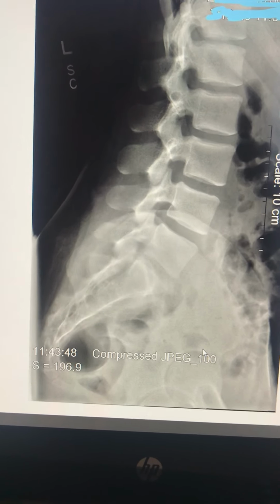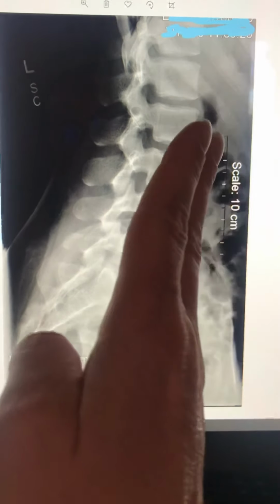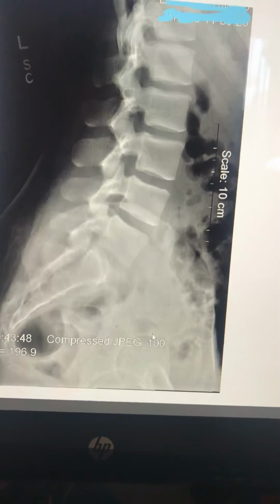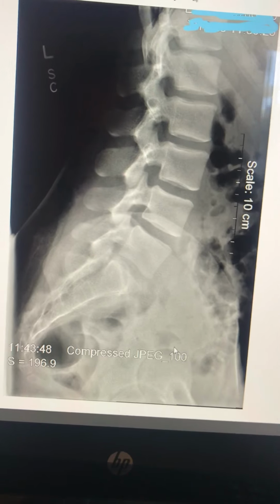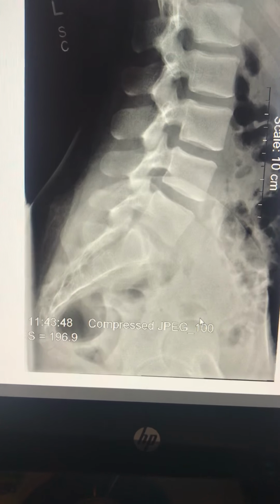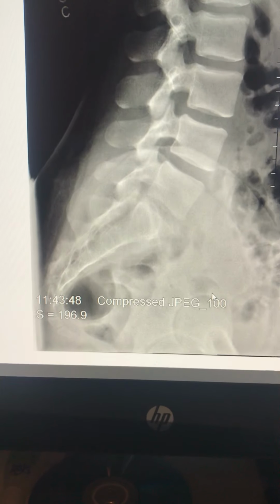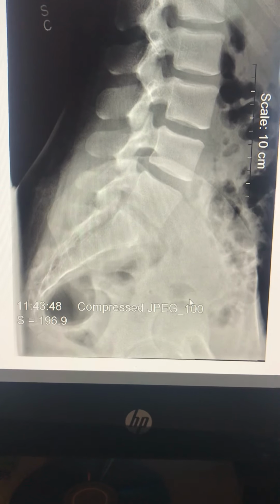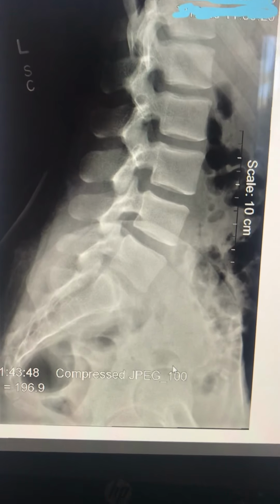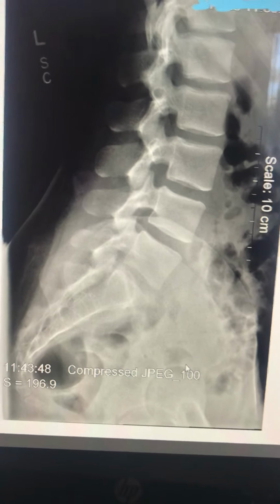The patient seems to not be completely straight. I think there's a slight curve going on. It could have been more like that. I could have either brought her shoulders back a little bit, or I could have turned the collimator box to match the length of her body to the length of my image receptor. The vertebral bodies are shown: intervertebral joint space, the spinous processes, and the sacrum and coccyx.